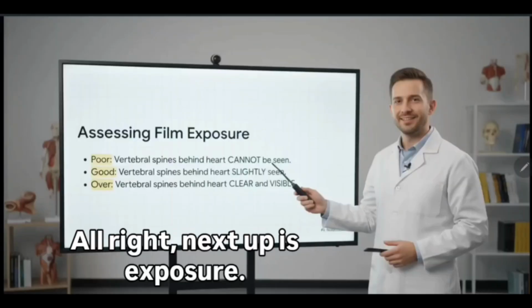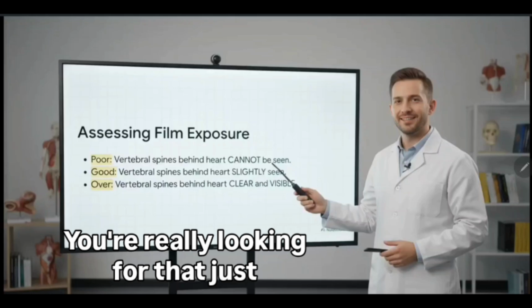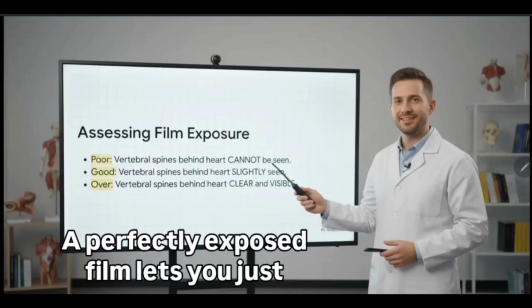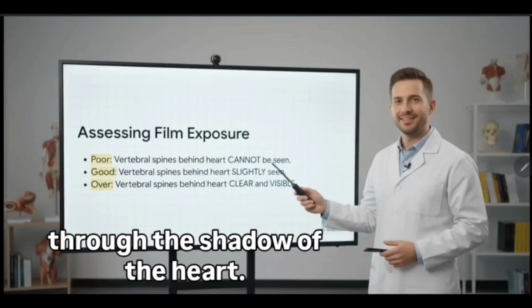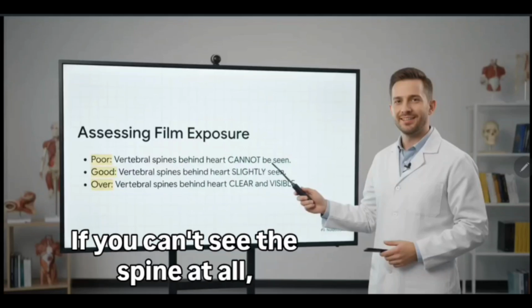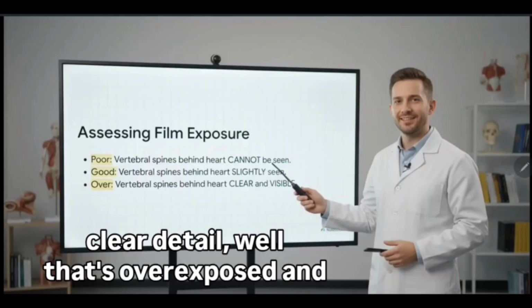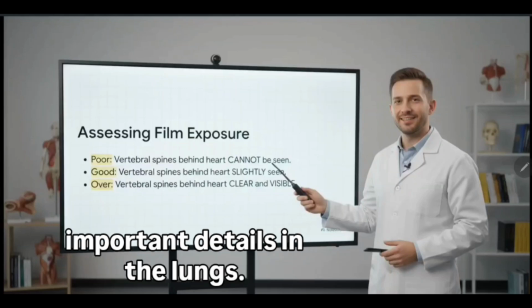All right, next up is exposure. Is the film too bright, too dark? You're really looking for that just right Goldilocks quality. And here's the trick. A perfectly exposed film lets you just faintly see the thoracic spine right through the shadow of the heart. If you can't see the spine at all, the film's underexposed. And if you can see it in crystal clear detail, well, that's overexposed, and that can totally wash out subtle but important details in the lungs.